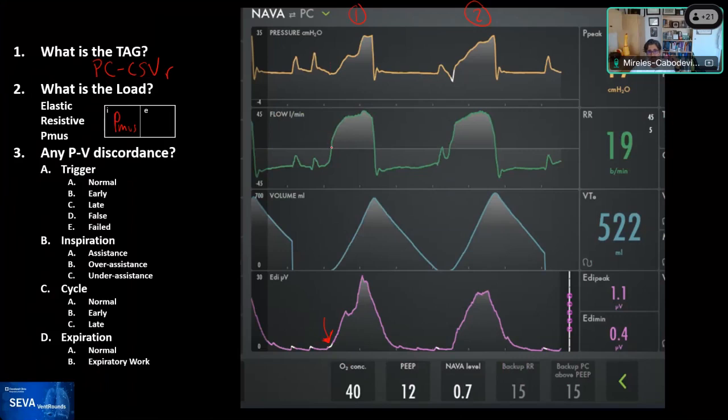That's what you would expect to see. And just to highlight why we are saying that: if this was pressure control and it was passive, you would expect to see this waveform, an exponential decay. Instead of that, you see an almost sinusoidal waveform, which is consistent with what you would expect with flow during normal breathing. Rob? Yes, that's very clear.